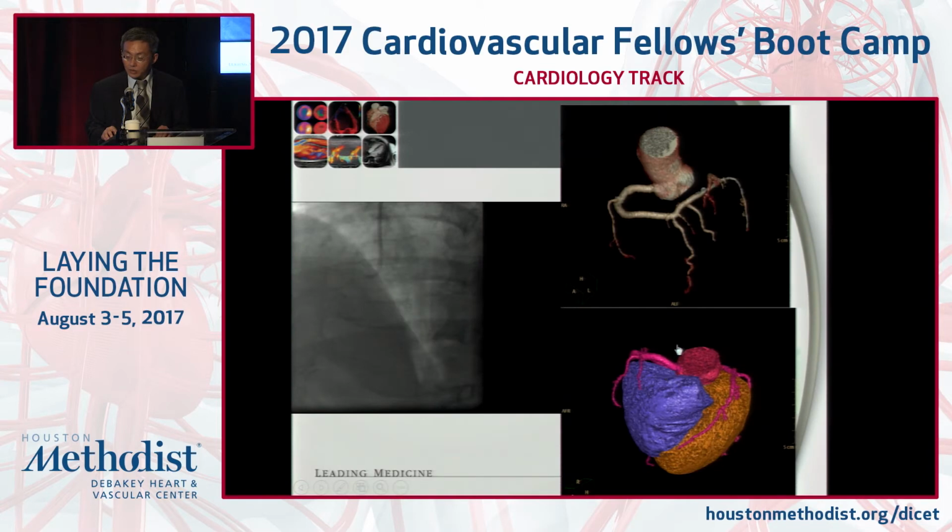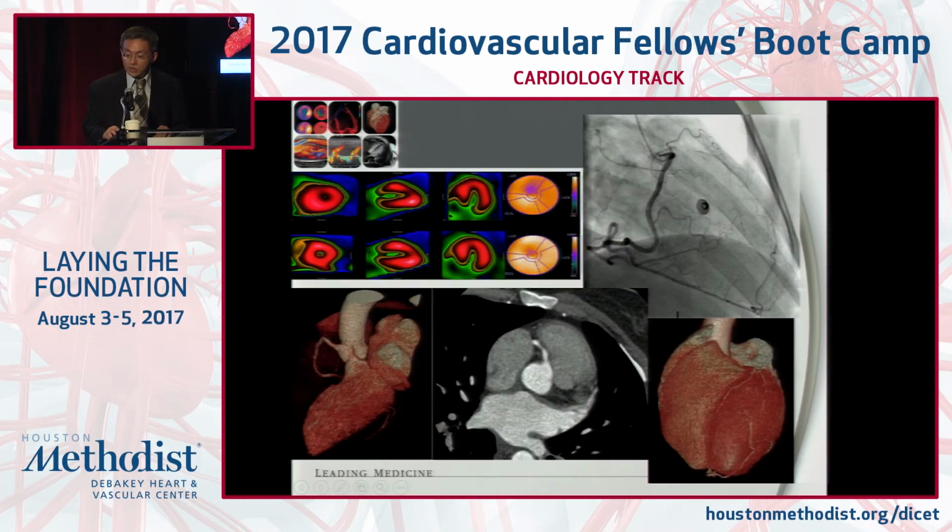This is a patient with a single coronary artery. Very interesting. She's in her 60s, had sudden death, and stress tests showed mild ischemia in the anterior apical wall. If you look at the CTA, that's the area where the single coronary coming out from the right coronary cusp barely reaches the apex. So this area is definitely hypovascularized, which caused her sudden death. I'm not so sure, and I don't know what the treatment is, but I guess at least you get the diagnosis.